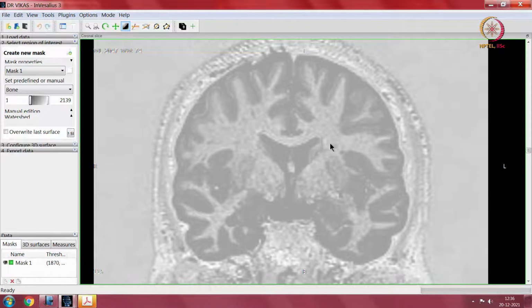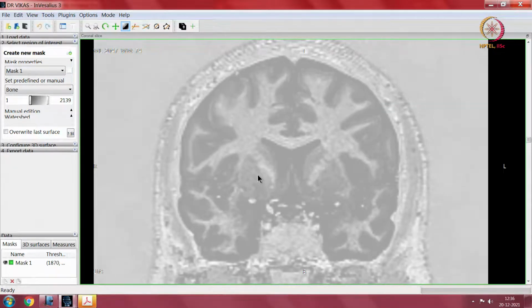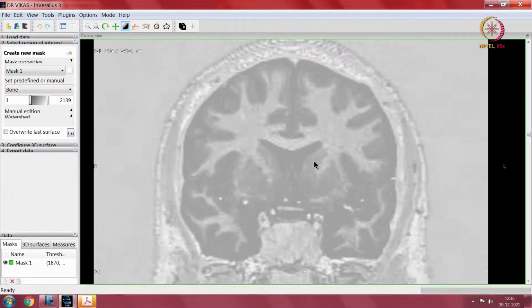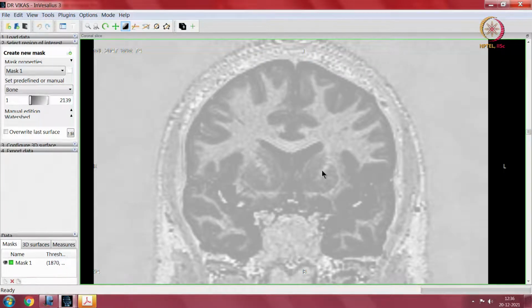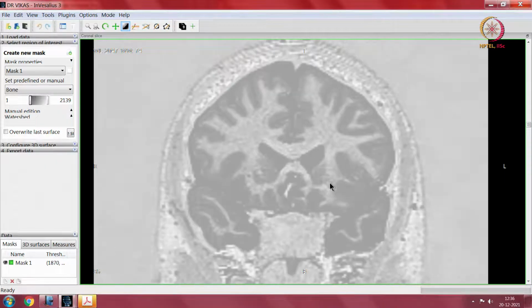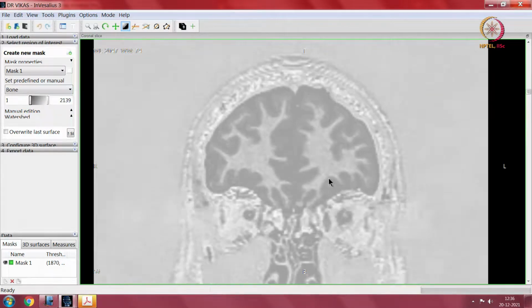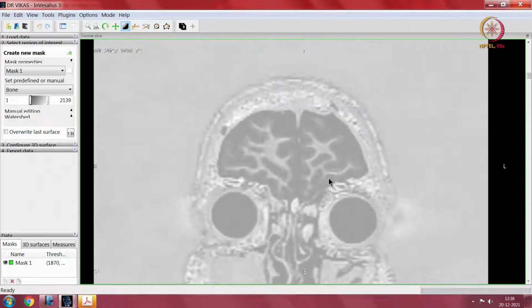Come more front, thalamus is only a small part over here. This is the caudate head which projects into the ventricle, lentiform nucleus, a bit more clear, and I think this anterior part is the globus pallidus over here, caudate head. So, this is caudate head again and the lentiform nucleus. So, that sort of finishes the description in the coronal sections.